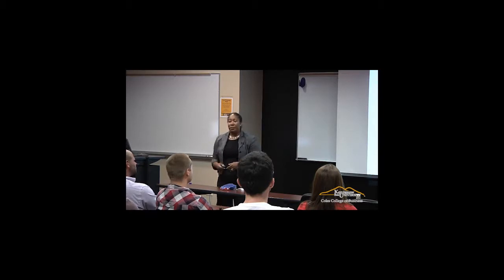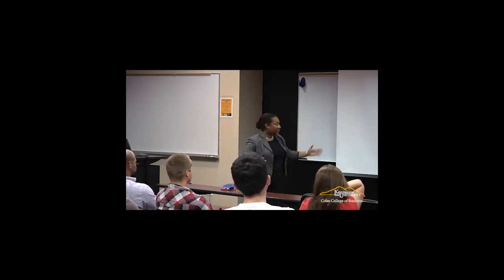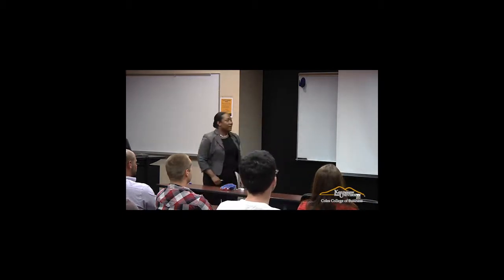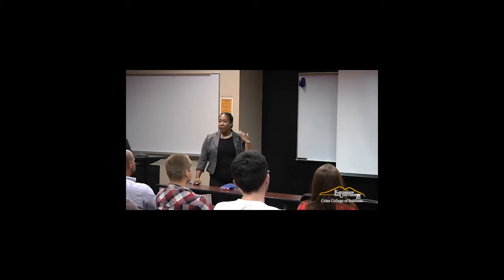We can also present an array of characters in a different way and let somebody spell with that ability. So let's say we're going to spell out KSU. So everybody will focus on the K, and we're going to have this random flashing of rows and columns. When the column or the row for the K flashes, we're all going to have a response, because that's the letter we're attending to. That's the one we want. When the other letters flash, the other rows and columns, we're not going to have a response.